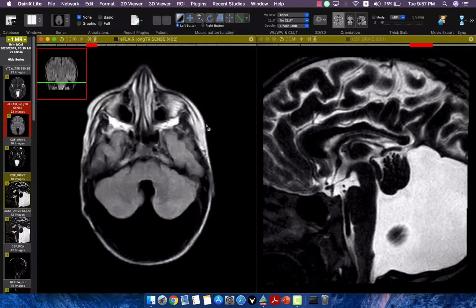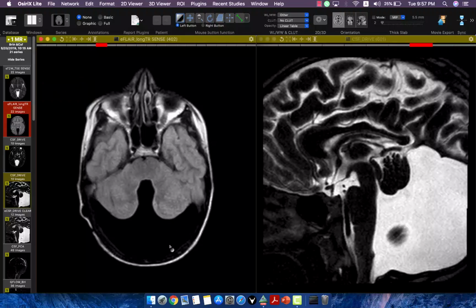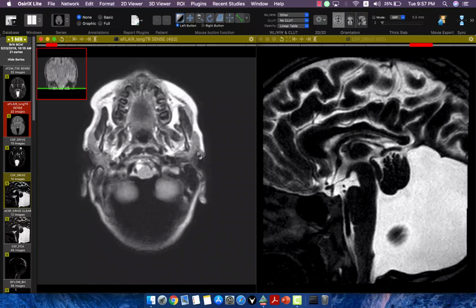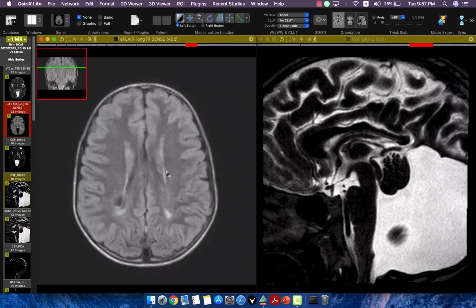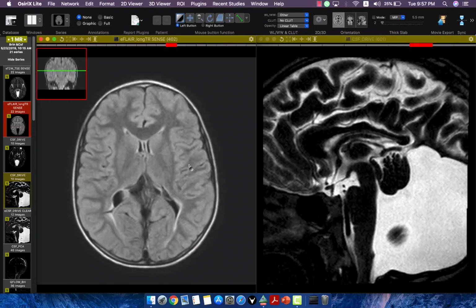This patient here is an example of Dandy Walker malformation. There is a large retrocerebellar cyst with absence of the vermis. So this is a typical example of Dandy Walker malformation. Dandy Walker malformation is usually associated with aqueductal stenosis, and in this patient there is an element of hydrocephalic changes, and a shunt tube has been applied here to drain them.